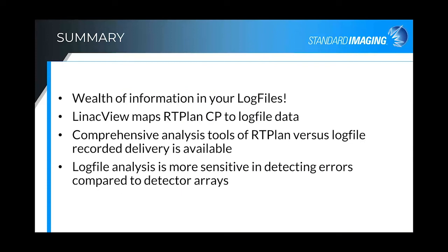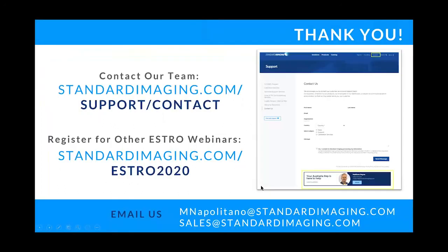So in summary, I hope that I have convinced you that there is a wealth of information available for analysis within your log files. LinacView software maps RTPlan control points to log file data. Comprehensive analysis tools are available, and I showed you just a few of those. Log file analysis is more sensitive to detecting errors compared to detector arrays. And so that concludes my talk about what have your log files done for you recently.